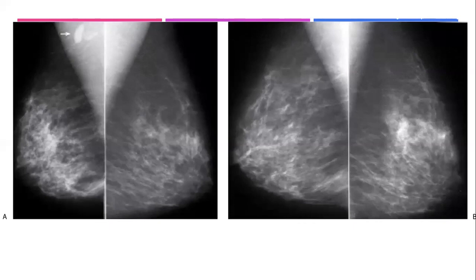What is the abnormality in this? This is not my case. All the previous cases are our cases; the majority are my cases and a few are from our institutions, from the system. But this case is from the literature, because I could not find an example for this pitfall. That is why I brought it for you from the literature. Okay.